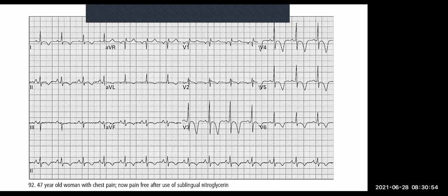So let's look at the septal part of the chest leads, all right? So we've got V1 and V2. What do we see there? Let's look at V1 first. Anything in particular that we notice? I would say just that this QT looks a bit long, eh? And this is not really a Q wave because it's not deep, not pathological. Okay. What about V2? We learned about this last week.